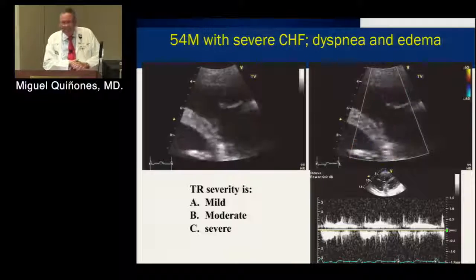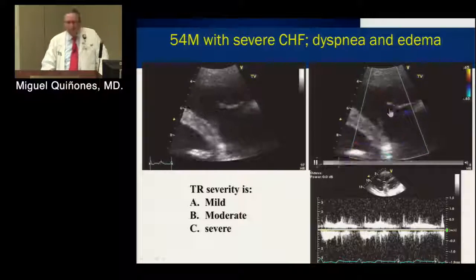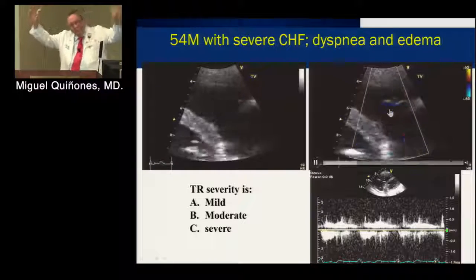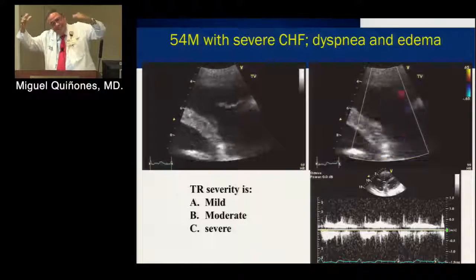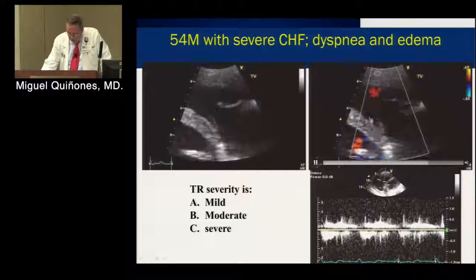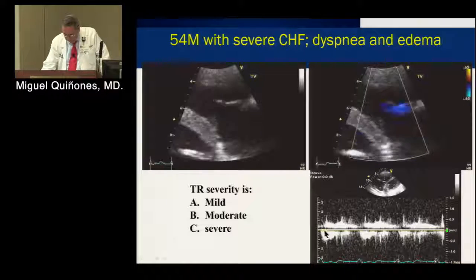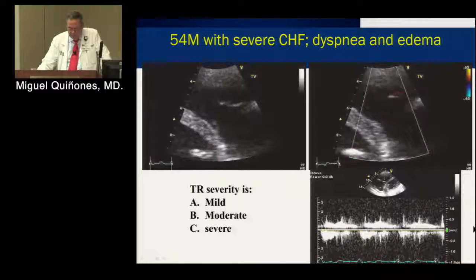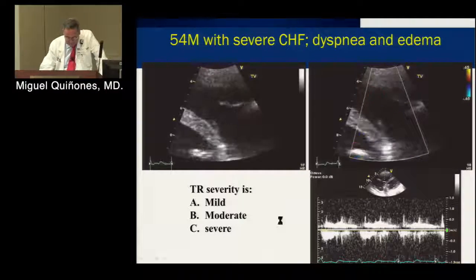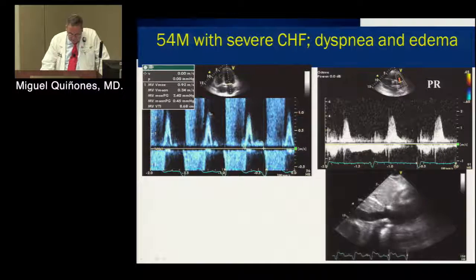Severe, right. You don't need a Doppler, right? Those valves are going like, hey, how are you? I'm doing okay. Feeling a little tired today. And of course, because it's such a low velocity, it's like having a common atrium ventricle, you practically don't get anything. Yeah, this is wide open TR. Impossible to give a PA pressure, right? Highly restrictive feeling, right?